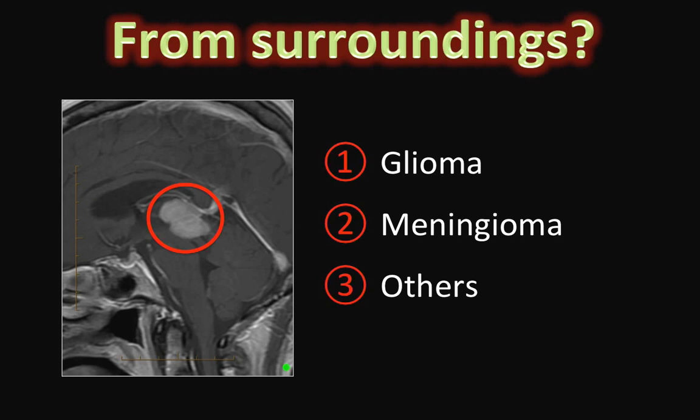Given that our patient is 62 years old, she's a female, the lesion was homogeneously enhancing with no features to suggest invasion or drop metastases, and I'll add that the tumor markers were negative in her case. All these factors favored pineocytoma.